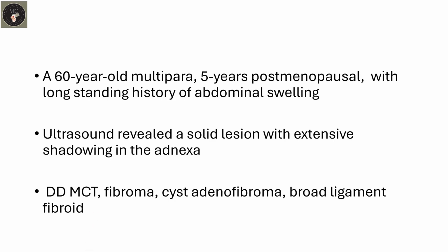Shadowing in the adnexa. What are the differential diagnoses? This case was that of a 60-year-old multipara who was 5 years postmenopausal and presented with a long-standing history of abdominal swelling. Ultrasound revealed a solid lesion with extensive shadowing in the right adnexa. So, what are the differential diagnoses of shadowing in the adnexa?